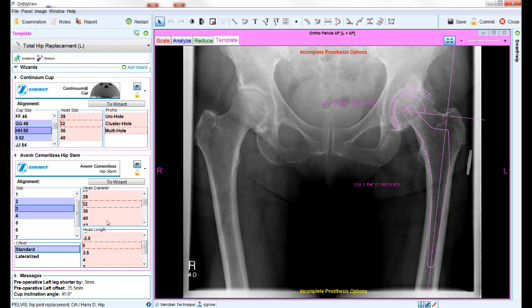While any red shaded areas remain, the software will display a warning message at the top and bottom of the main image, and the template outlines will remain in a lighter color. Only once all the values have been fully set will the template outline change to a darker bold color.